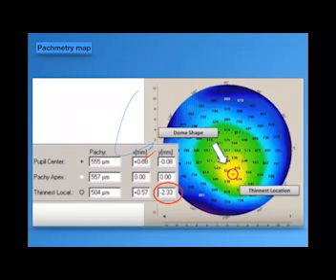ablation. So the limits: 490 or more, other figures okay, you can go for flap. You can cut and go for refractive surgery. Less than 490, down to 465, and normal elevation, normal topography, this is a normal thin cornea, but not to weaken it more, go for PRK.